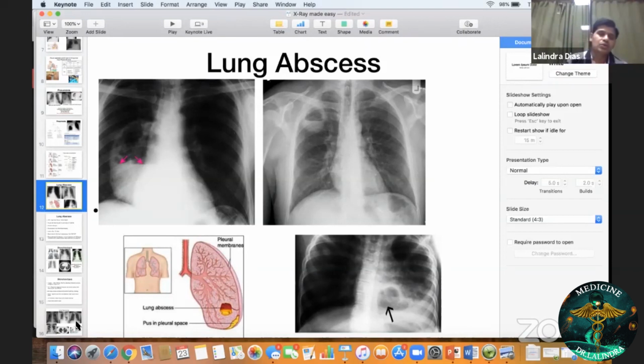All right. So you can see here, this is a patient with lung abscess formation, and you can see air on top and fluid at the bottom. So it's an air fluid level. That's characteristic of lung abscess. So lung abscess appears a rounded lesion, but in that you see this air fluid level. So air on top, fluid at the bottom, air fluid level.